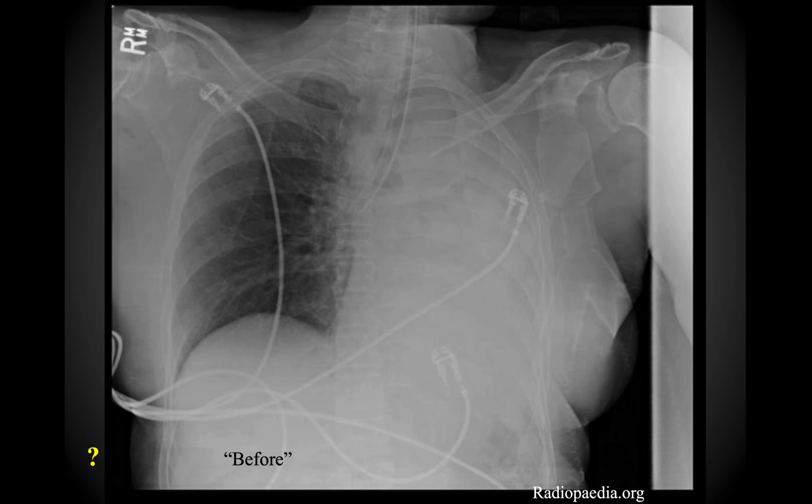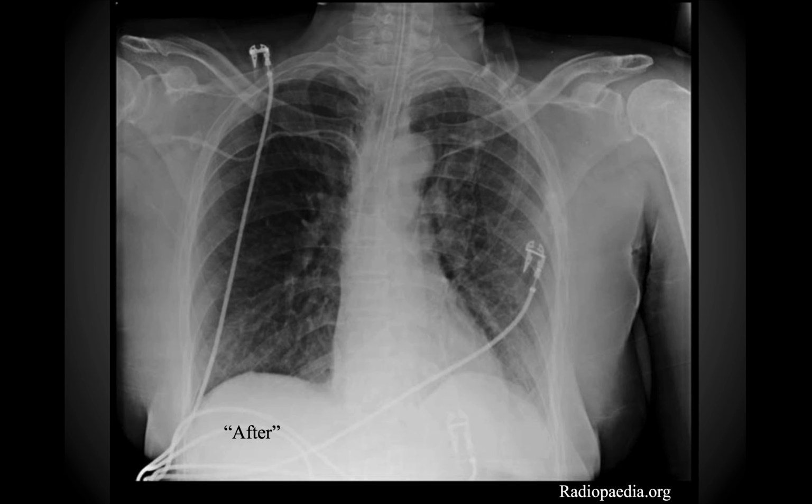So if we go back and look at what this looked like zoomed out, once again, you can see that ET tube coming down and stuck here in the right main stem bronchus. And then now where the tube has been pulled back just a little bit past that, so it's above the carina, and now you get good ventilation of both the left lung and the right lung in this individual. So this is after the ET tube placement was fixed. So you can see how significant a chest x-ray can be in terms of determining an issue like why one lung is not able to be ventilated in an intubated patient.